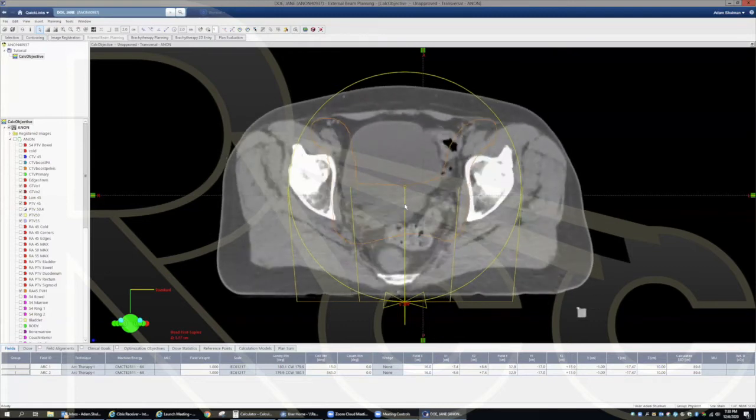But when you get these jagged, it's not a circumferential shape, so it's weird with horns there, so probably. Yeah. Exactly. So I'll be limiting dose inside of here, limiting dose outside, trying to make it conformal. These sharp points, it's just more difficult for the optimizer to push that dose in there conformally.